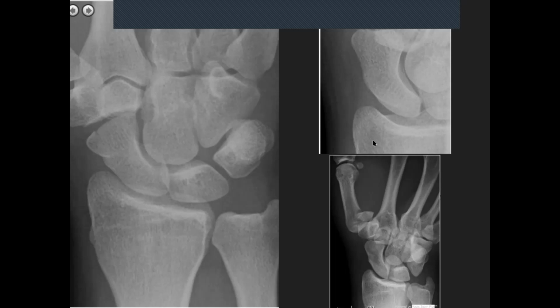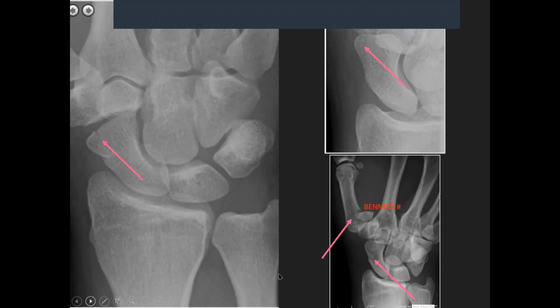Okay, that's going on. If you come to this one, you can see another scaphoid fracture that's just running through there. I'm afraid to annotate because right at the top it may not show properly. And if we have a look at this one, you can see there's a fracture at the base of this metacarpal. And if you look closely, you can even see the fracture in the scaphoid that's going on over there. I think it is, if you look quite closely. So these are the three fractures that you would get. Okay, yeah, there we go. So I had actually pointed it out.